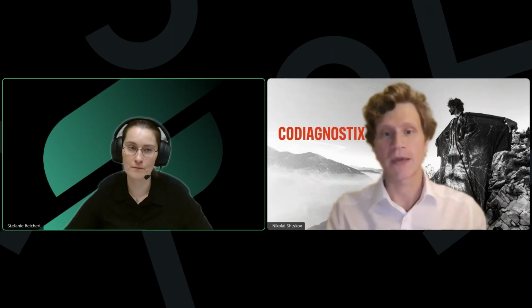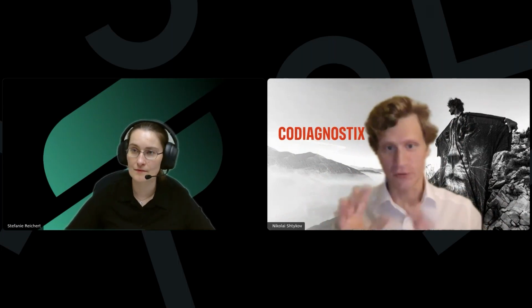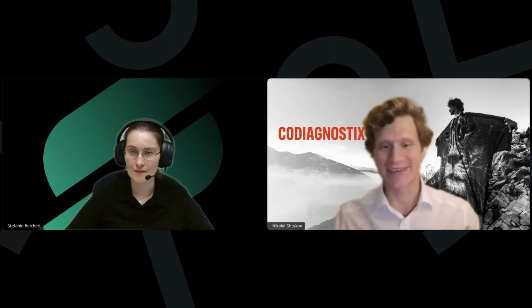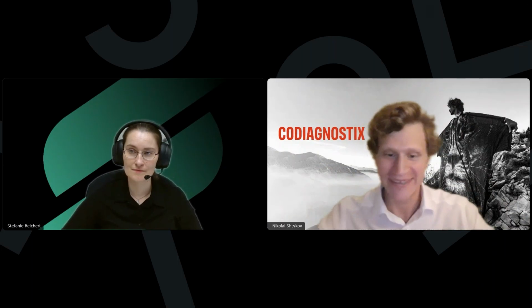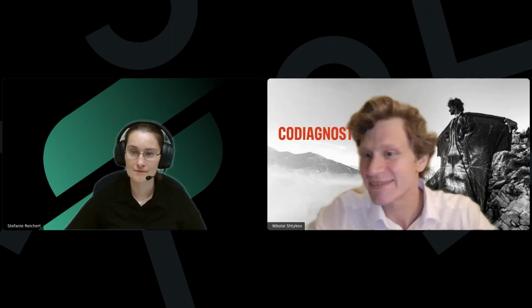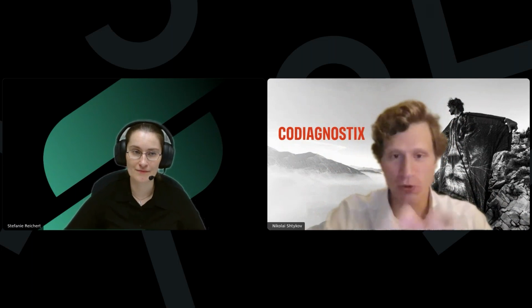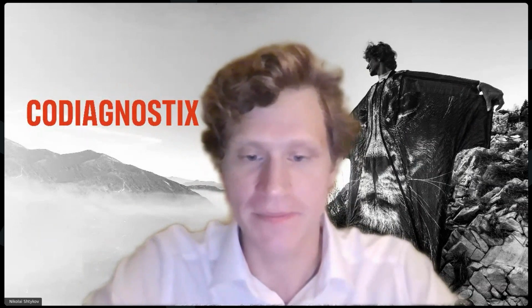Okay. If this is about the cage, I will show you. This is a kind of tricky way, but interesting. So this is coDiagnostiX. Every time we have a lot of different instruments to achieve our goals. If somebody else would like to know how to do this, sure, I will show you both things. Let's share the screen.